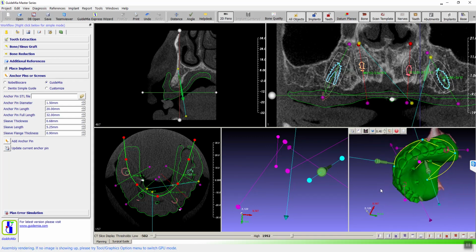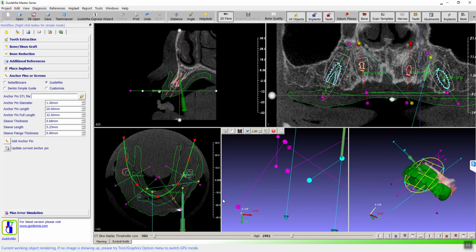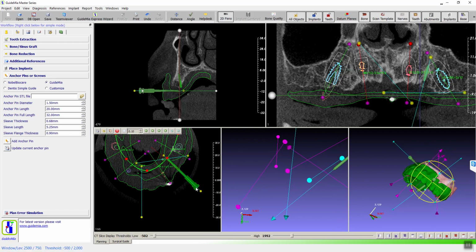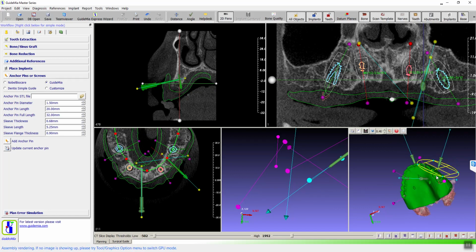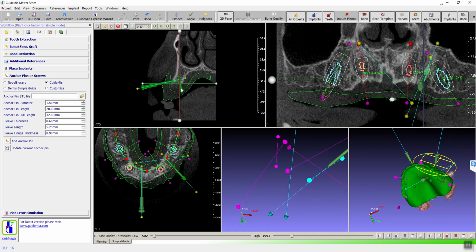So this is where the pin is. And then let's say we want to place another pin. We want to go on this side, for example. So we can use any of those views to adjust. We can do that too. Oh, so this is another pin. So they are too close. Let's say we move a little. Or maybe I should have moved this one.